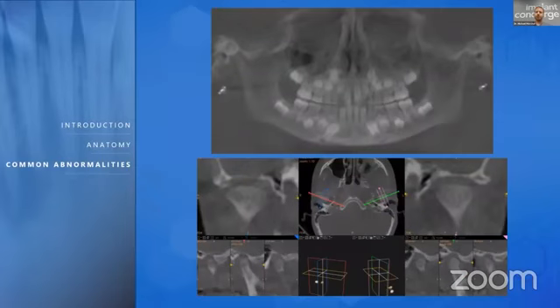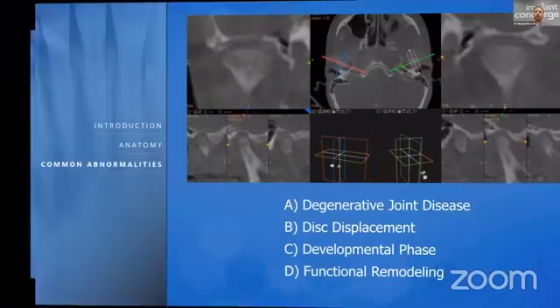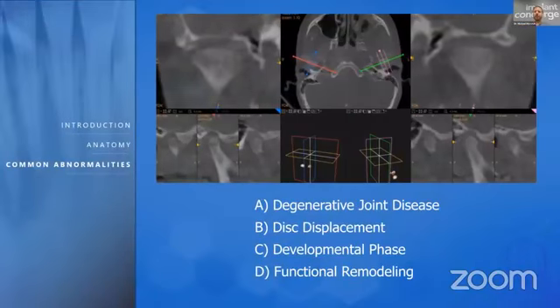So now this is the same patient. Does your opinion change of what you think it might be? And again, you have to be a detective because we only have a snapshot in time of what this might look like. Here, this is a kid. So if we go back now, looking at this is a developmental stage. As the patient's getting older, the TMJ is going to continue to grow or change up until the patient's in their 20s. And that's why, if TMJ was the hugest issue 10, 15 years ago, there was a lot of research done in it.